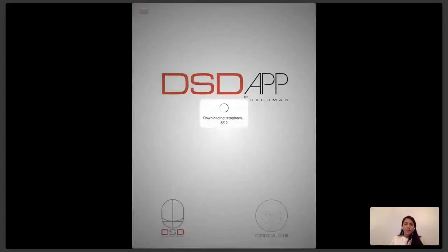Okay, so let me share my screen with you. Perfect. So now you can see my screen, and we're going to create a simple smile simulation together.